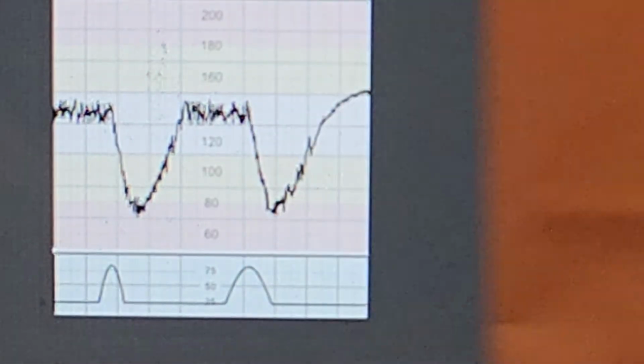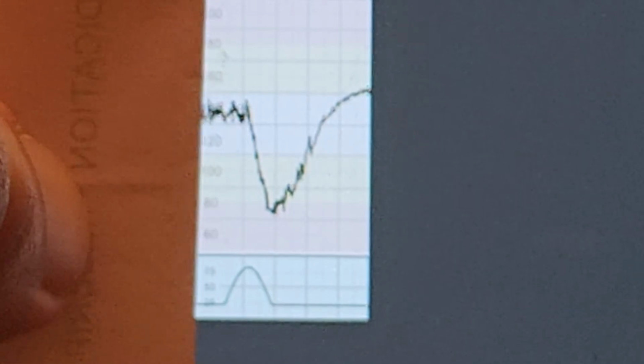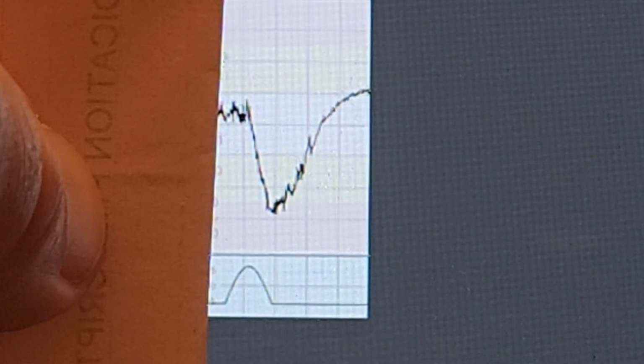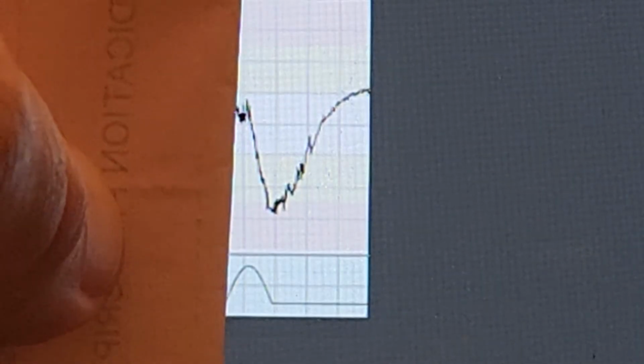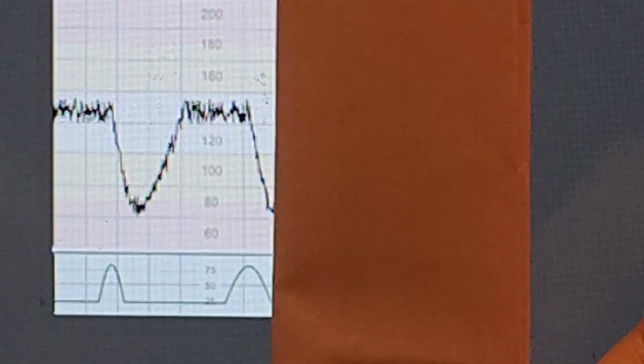So it is after, and again there is a contraction that started here, and what happened is the baby maintained the heart rate for some time, and then started to decelerate, and here exactly the same, the contraction recovered, and then after some time the deceleration recovered.